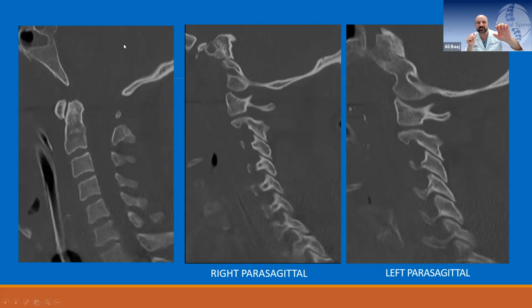And if it's more than 10 millimeters for me, if it's more than a centimeter, then I get worried. But I will say this to me looks probably longer than that. But if I look at the parasagittals and I saw perfect alignment of the condyles on the lateral masses, I probably wouldn't make too much out of it, honestly.